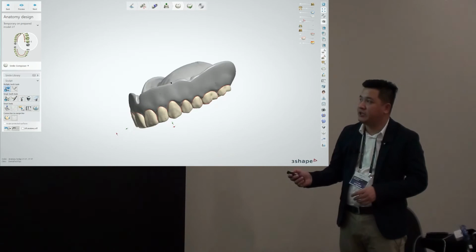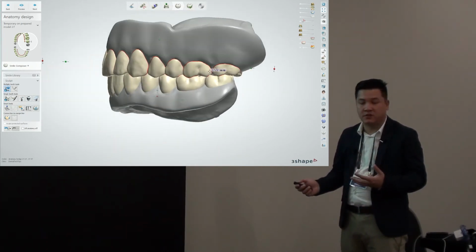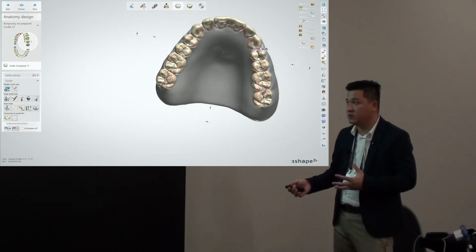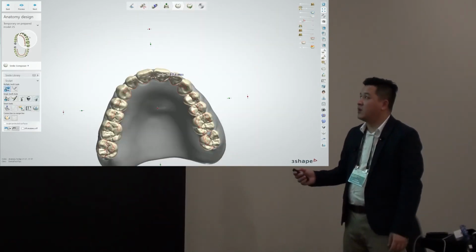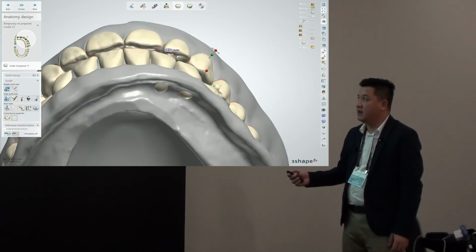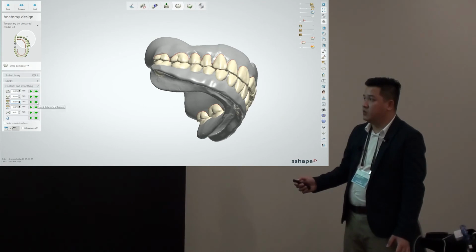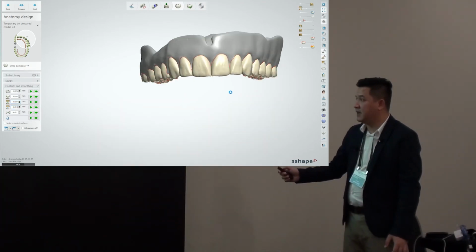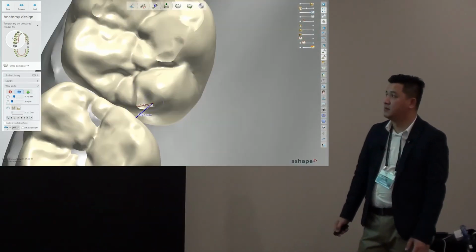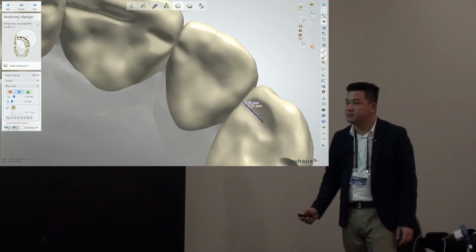And you'll really appreciate this if you use the denture teeth module. You don't have a lot of these tools. So if you're familiar with crown and bridge tools in 3shape, there's a lot of limitations there. But what I'm doing now is I grab those files that I've made and I'll bring them back in and I'll align them and I'll use those to check my clearance, sculpt the denture base as needed, adjust the occlusion again.